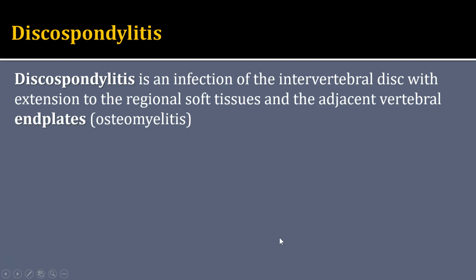Next, I'd like to talk a little bit about infection of the spine. As we've already learned in our other musculoskeletal lectures, we've talked about what infection might look like. Infection of the vertebrae can have very similar radiographic signs, so we can have varying proliferation and lysis.